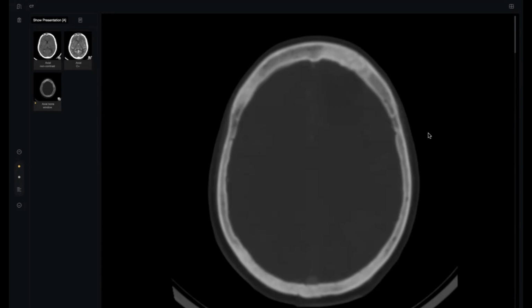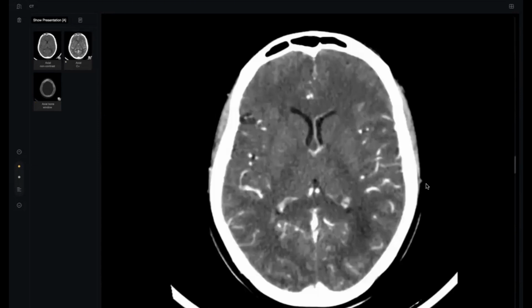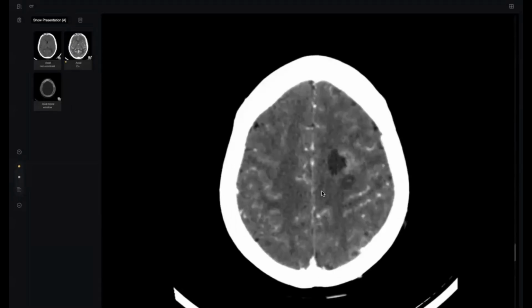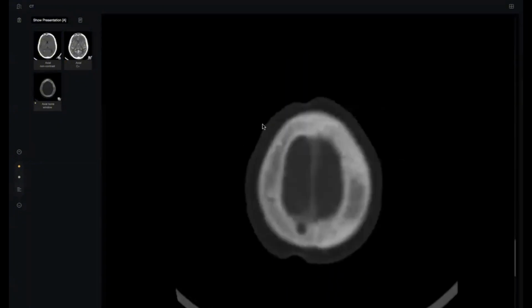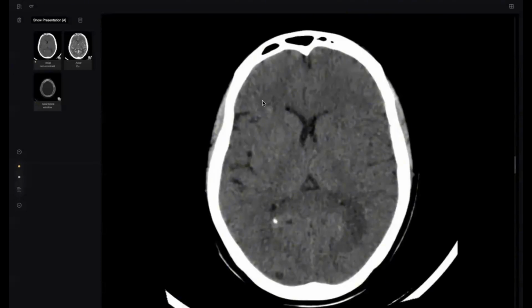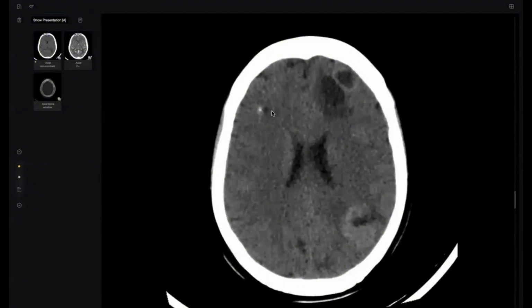My colleagues, it is a very obvious case of cystic metastasis of the brain. As you said, this is not a benign cyst. Why? Nodular peripheral enhancement, very clear. Then the doctor did very well when she asked for the bone window. If you are talking about this calcification on the right side, yes. Thank you, doctor. Next candidate.